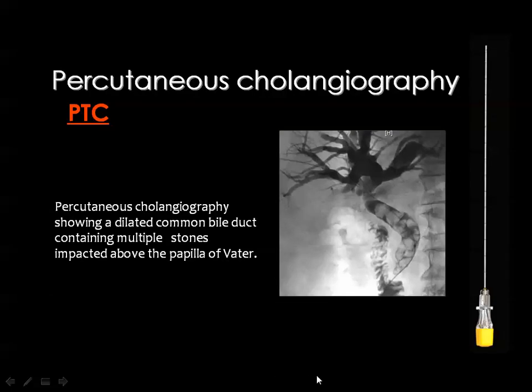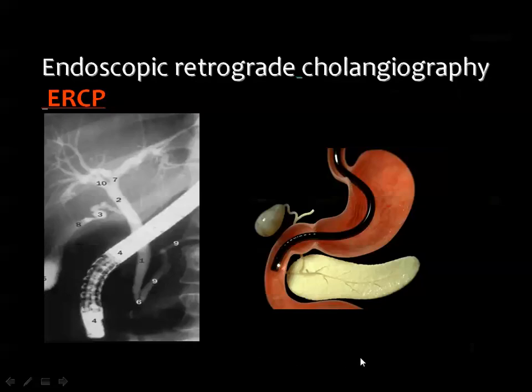Then this is also a percutaneous cholangiogram. Here is the needle, and you can see that the common bile duct contains too many radiopaque calculi. Of course, you can introduce some guide wires and catheters in order to drain this biliary system to the outside.